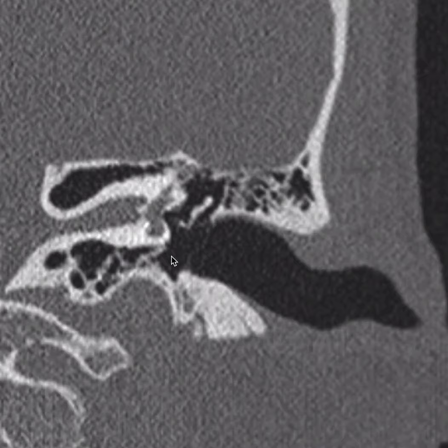The hypotympanum is everything below a line drawn between the tympanic annulus here and the cochlear promontory here. None of the ossicles are down here in the hypotympanum. We'll now review these on axial CT.